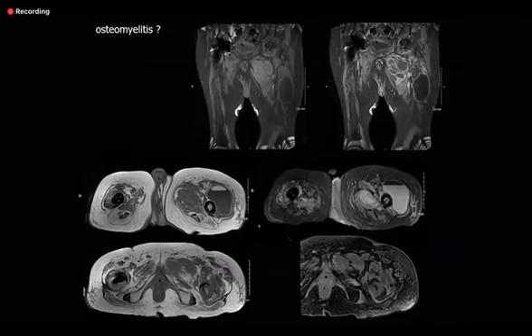Is there osteomyelitis or not? Yes, the presence of fat indicates that the marrow has been involved. So this is taken as an absolute specific sign of osteomyelitis. You will rarely see it. Of course, you can infer there is destruction of the cortex and so on. But if you see fat, it means the fat has come out of the bone. So it is very rare to see. If an examiner has got this kind of case, you should know this finding.